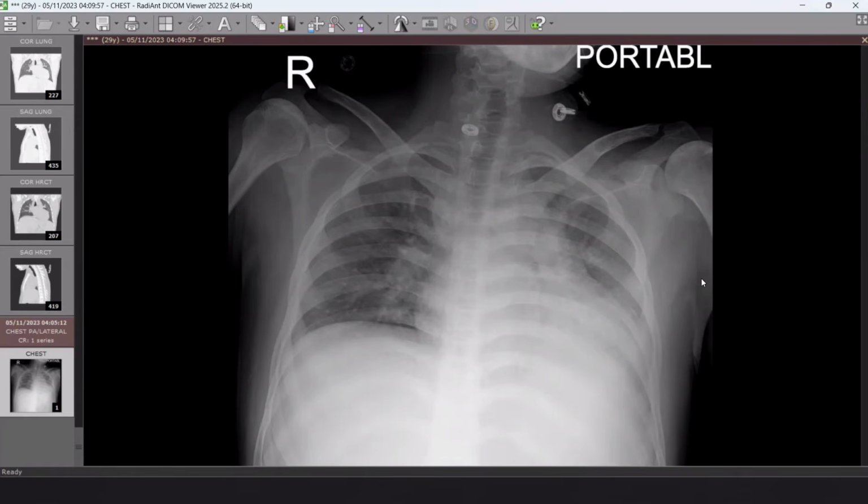You told me that the bronchus is amputated, but we have here some sort of left hilar air bronchogram. It's not obliterated, but it's very clear to see the air bronchogram. What do you think?